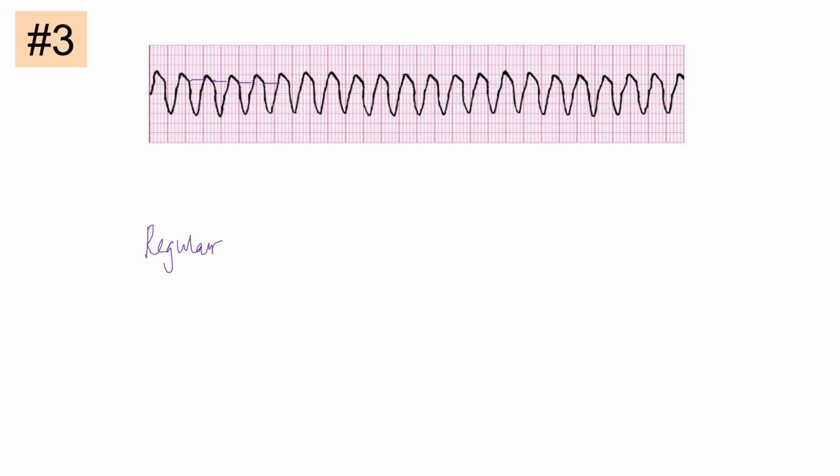Now, this wave does represent a QRS. It's just really wide, and it doesn't look like how we normally would say QRS is, but this is a QRS. So this tip here is going to be our R, just like anything else. So let's find out what the rate is.